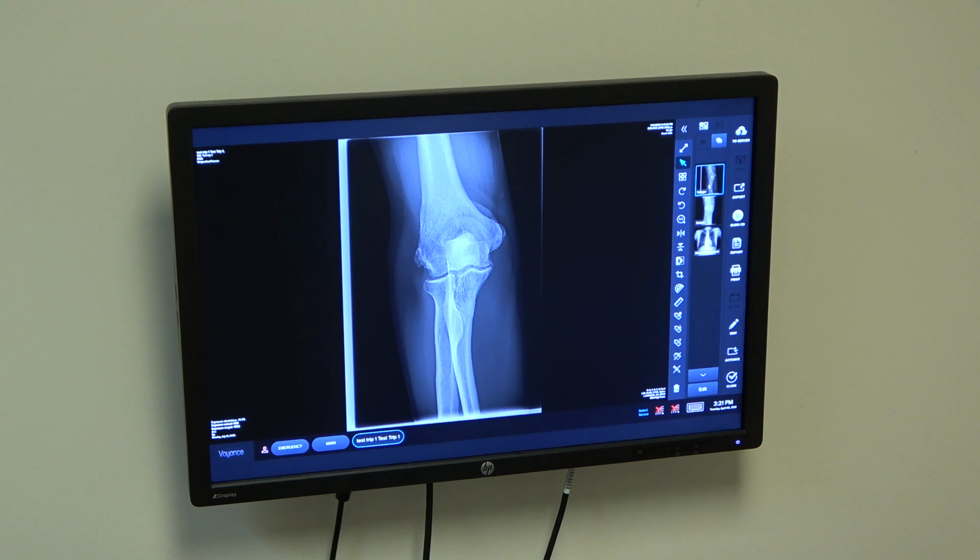We're going to stitch, if this were 2 or 3 images of like a cervical, thoracic, lumbar spine, you want to stitch those, you would click the first image, hold the control down, click the second image, and then if there's a third, you hold the control down and pick the third image. Once you select at least 2 images, then our stitching icon lights up. And if you fly over these tools, each will tell you what they do. So here we've selected 2 images, so we have the capability of stitching with a license on this system.